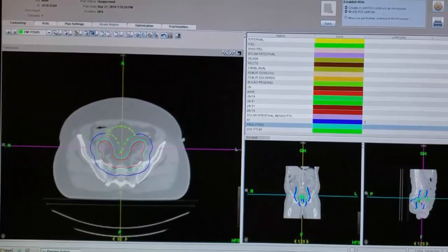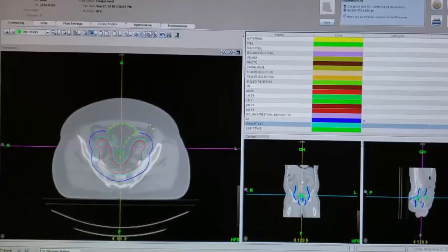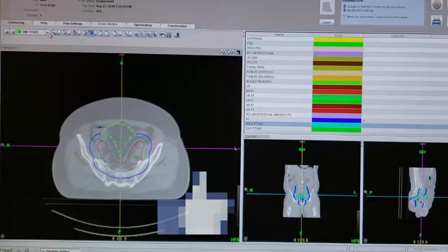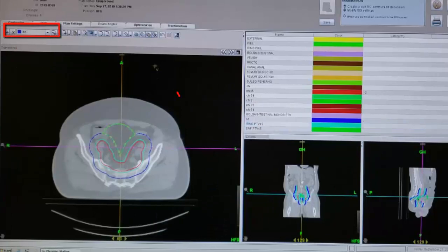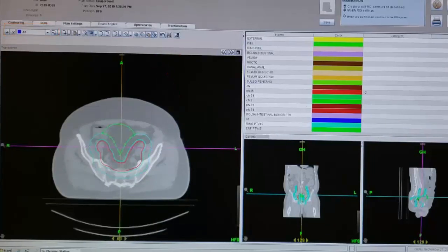We apply everything that is done with the structures. First we save, and then we reduce points, and we check that it is in place where we want it to be. If everything is perfect, we then modify the auxiliary A1, and for that we'll select and delete everything we already have contoured in this structure, because we will do the following.